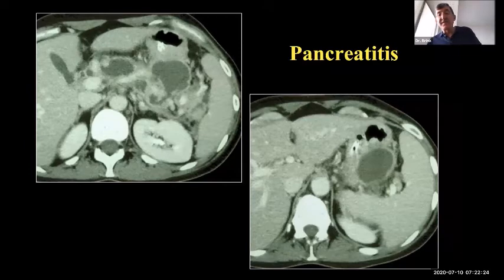Pancreatitis very commonly involves the gastrosplenic and splenorenal ligaments. We often call these fluid collections peripancreatic fluid collections, but I encourage you to be thoughtful about where they exist. Almost always these are subperitoneal collections, opening up potential spaces within adjacent ligaments and mesenteries, and this one is no different, opening up a potential space in the gastrosplenic ligament. And you know these to be subperitoneal because they're the same day after day, week after week. They don't change because they're really confined within the subperitoneum.